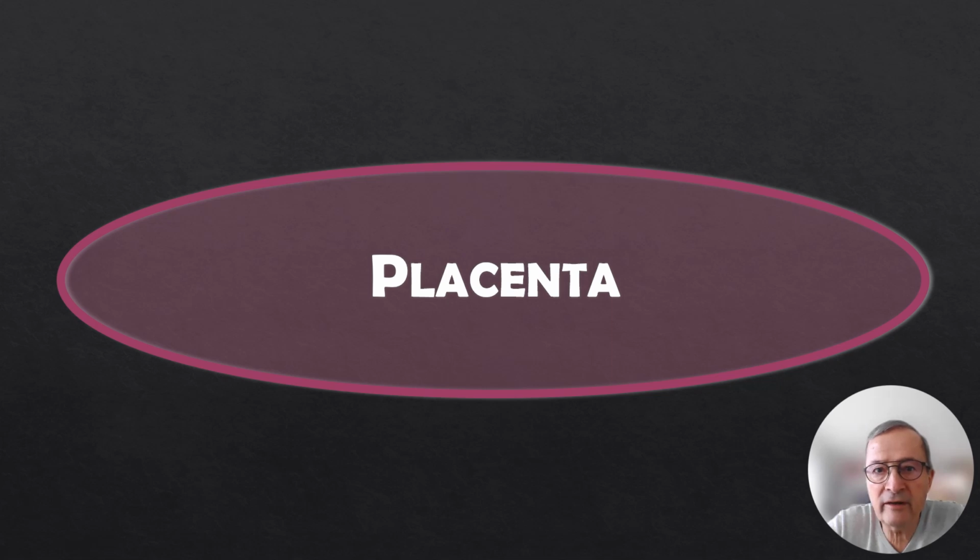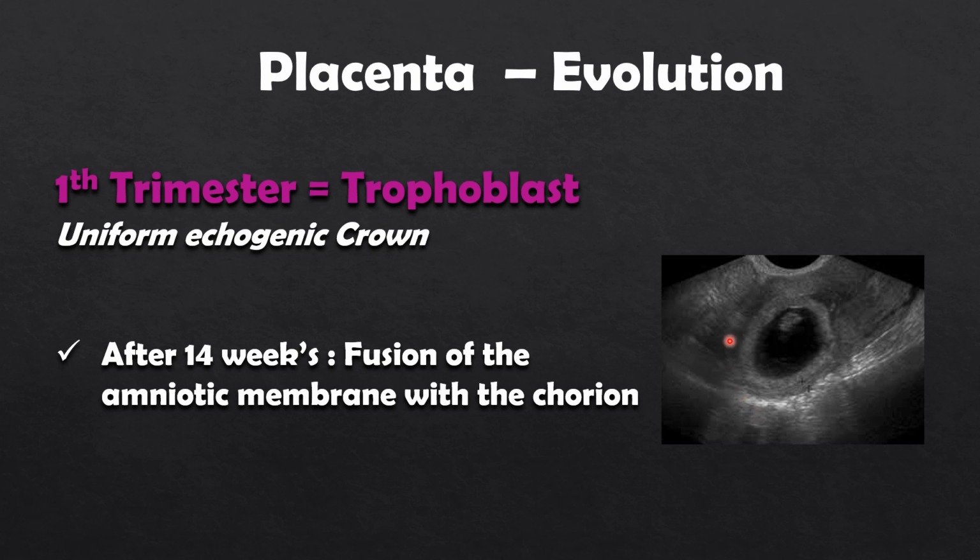The second point concerns the placenta. In the first trimester, the trophoblastic crown is uniform and hyperechogenic. It thickens over time, and from 14 weeks, we will look at fusion of the amniotic membrane with the chorion, and the extraembryonic coelom disappears.